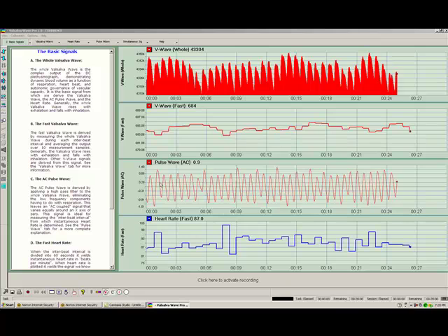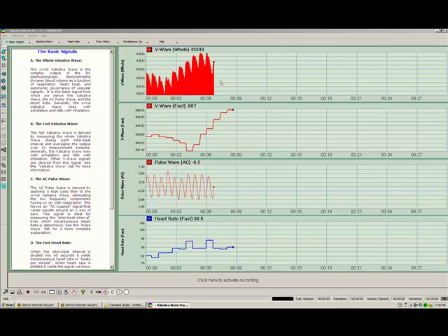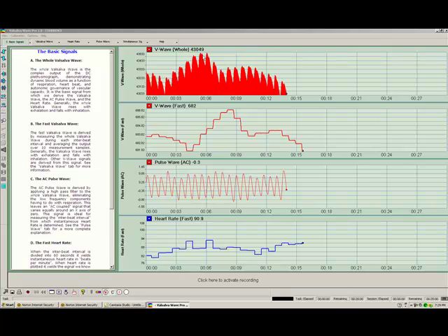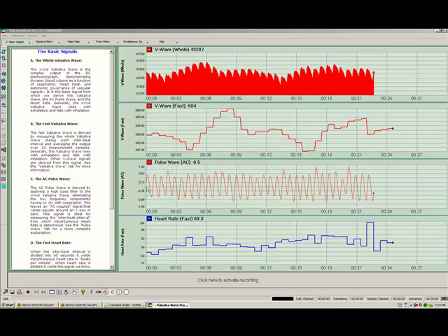Below that is the AC pulse wave. This is derived from the top edge of the whole valsalva wave. You can see that they map very directly with each other. The AC pulse wave is an AC filtered version of the whole valsalva wave, which basically takes off the relatively high frequency AC variation as a function of heart rate and plots it here as a line graph centered around an x-axis of 0. You can see the x-axis is the center line right along here.